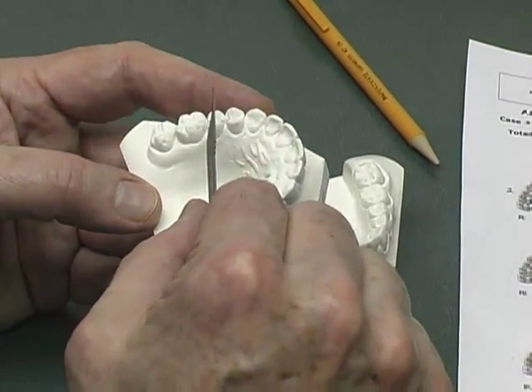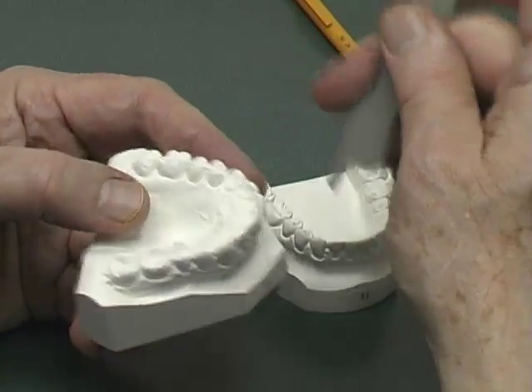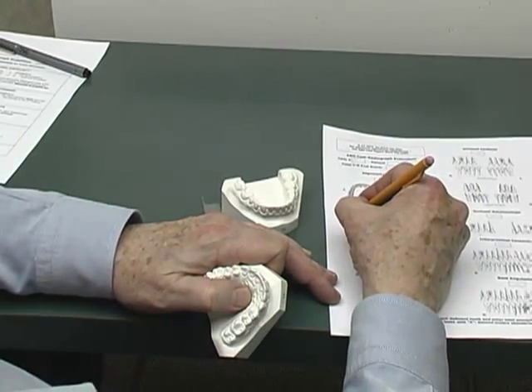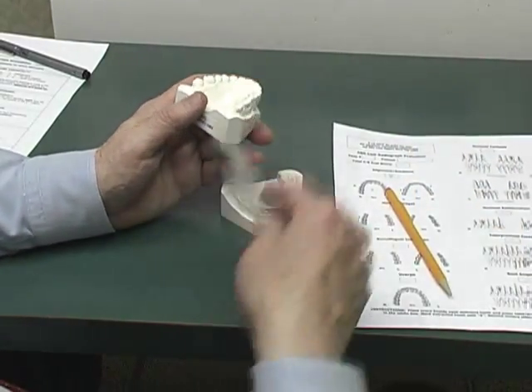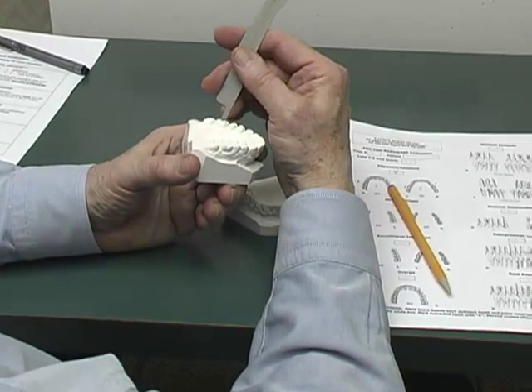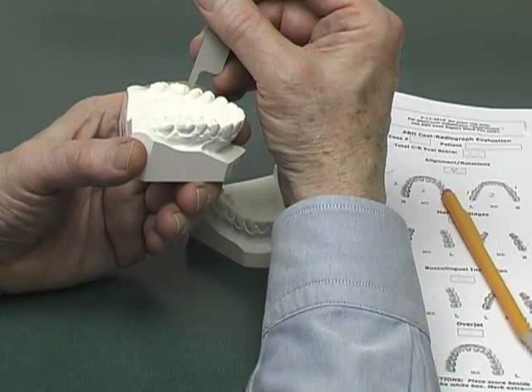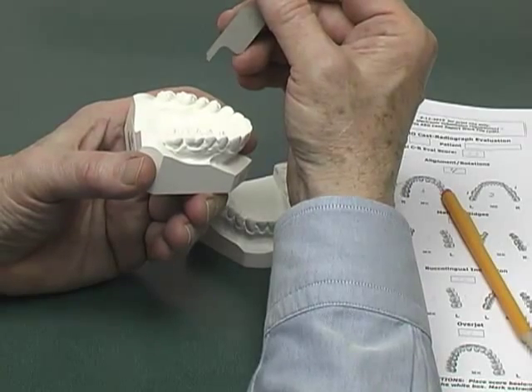Likewise, the first molar to second molar is 1 point. So that will be 2. I'm going to score these 1, 1 on that right side. My rule of thumb for measuring marginal ridges is if there is a catch, but the 1 millimeter step clears the adjacent marginal ridge, it is less than a millimeter. If the ridge is above the 1 millimeter step, of course, it is 2.